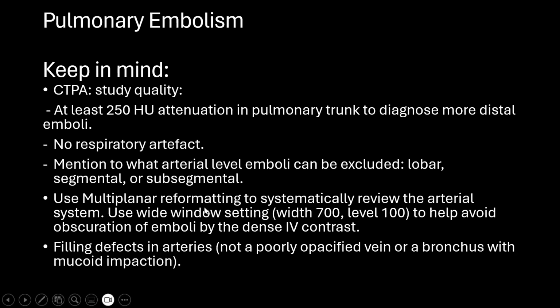We use multiplanar reformatting to systematically review the arterial system. Some people advise using wide window settings to help avoid the obscuration of small emboli. We also need to make sure that the filling defects are in the arteries themselves, not in a poorly opacified vein or a bronchus with mucoid impaction.